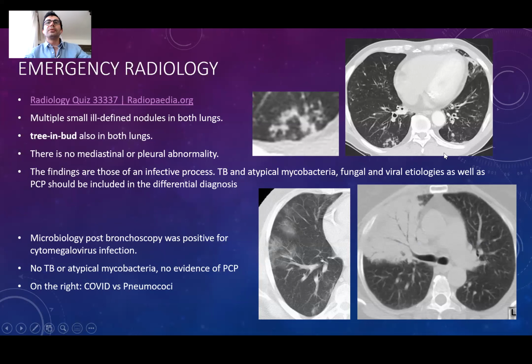And sometimes pneumonia can present like this case we have seen. In this patient, the pneumonia cause was cytomegalovirus. But mostly, if I see something like this, I would think of other infections like mycobacteria. And in immunosuppressed patients, pneumocystis pneumonia is also very common, especially in AIDS patients. It's a long story. Now AIDS patients almost never occur. HIV positive patients never go into AIDS now because of good therapy. But it was a big thing before.